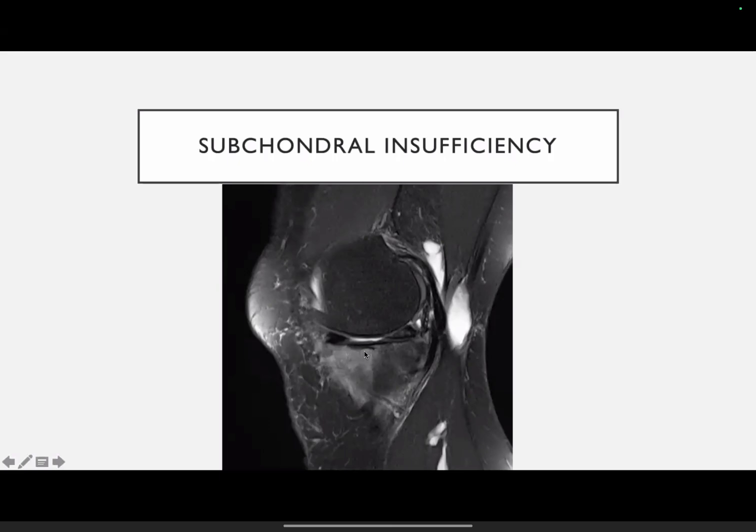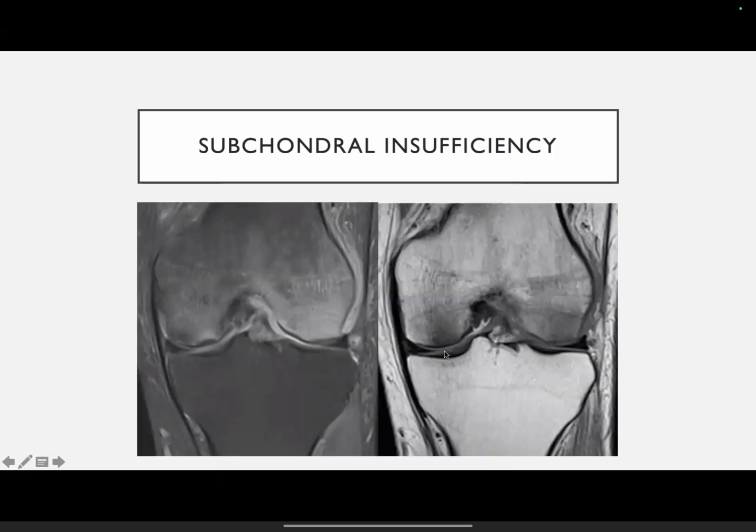plate. So this is a subchondral hypointense fracture line, or what is called a subchondral insufficiency fracture, leading to moderate bone marrow edema. This is secondary to a stress on the bone in which microfractures occur in the bony trabeculae. Along with that, we see a Baker's cyst, which is not yet ruptured and is just incidentally seen. There is associated degenerative signal in the posterior horn of the medial meniscus, but no discrete tear at this time.